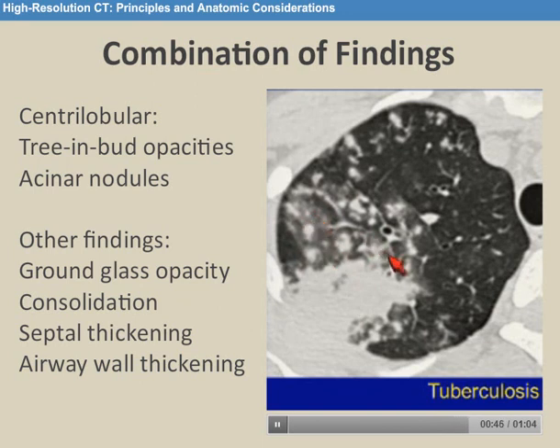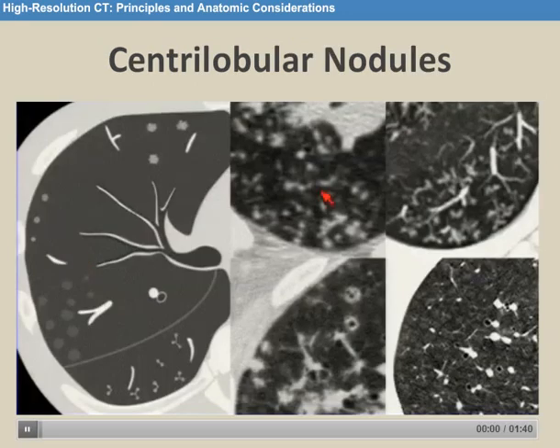If we look closely, we can see some interlobular septa outlining some parts of the secondary pulmonary lobules, and we can also recognize some airway wall thickening in comparison to a more normal airway in the adjacent parenchyma. So you'll often find these things in combination, and you just have to recognize the findings, the patterns, and then take it from there. So here's our diagram again.